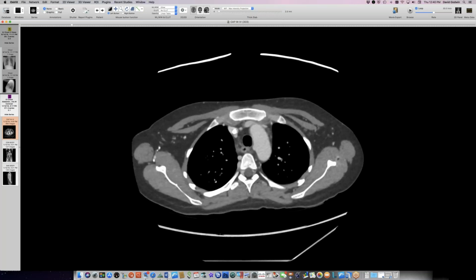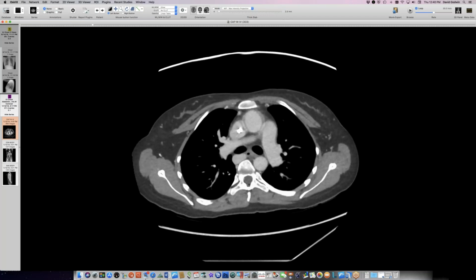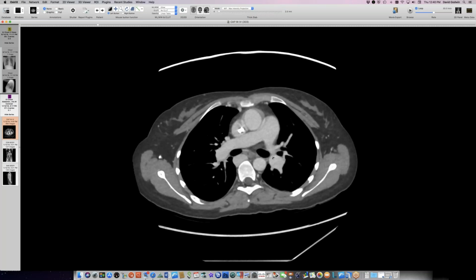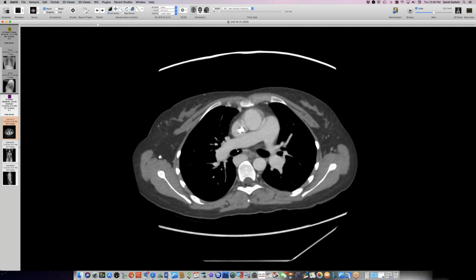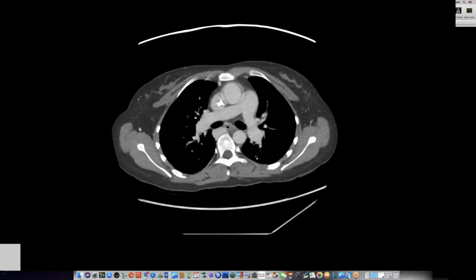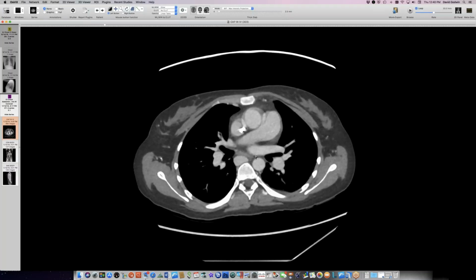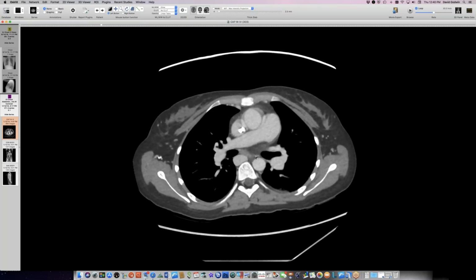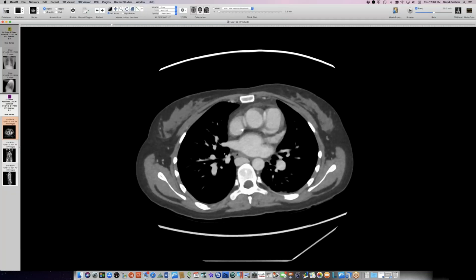It looked like when you were showing the main stem bronchi there that they look fairly symmetric. But we've got a left pattern here with a pulmonary artery going over its bronchus here, correct? And the right PA is in front of the bronchus, not going over the top of it. So we seem to have conventional proximal anatomy there. But we do need to count lobes and see how many lobes. I think this is still just the upper lobe bifurcation there.